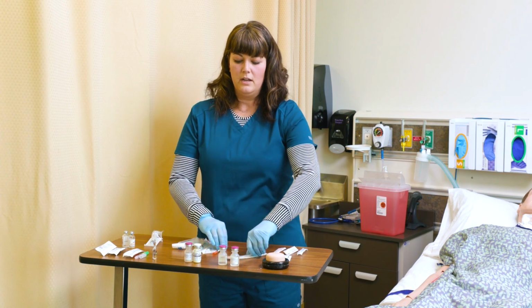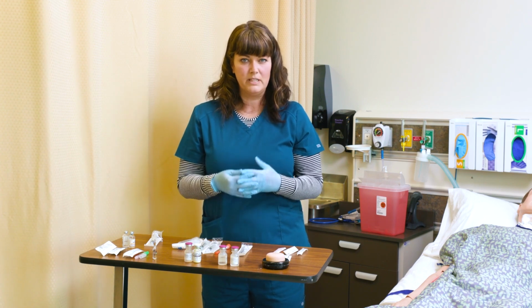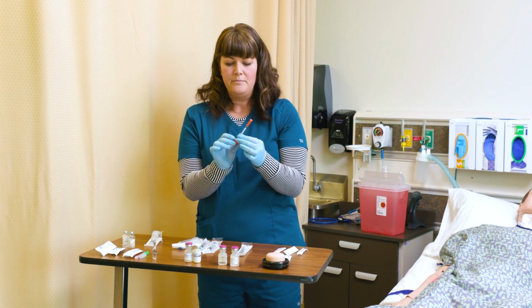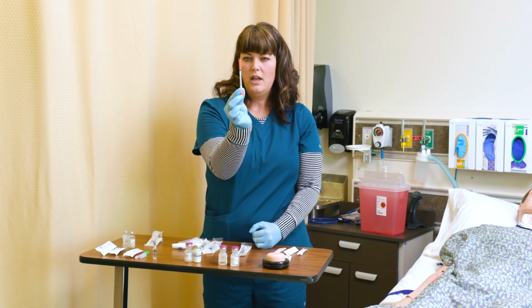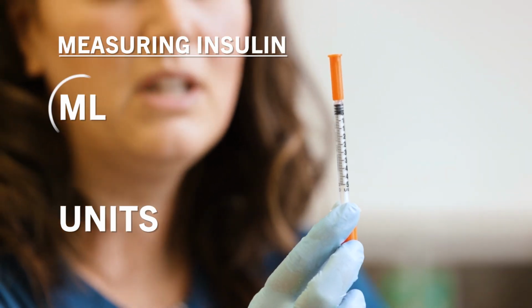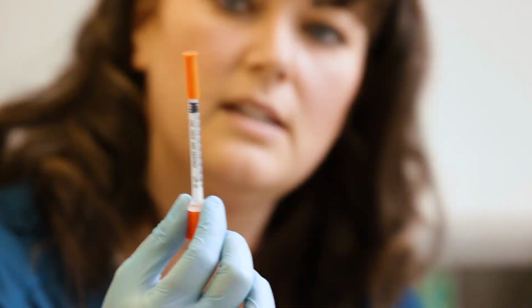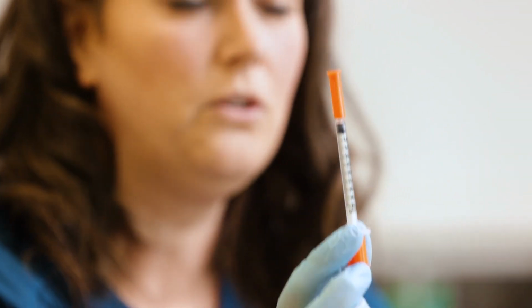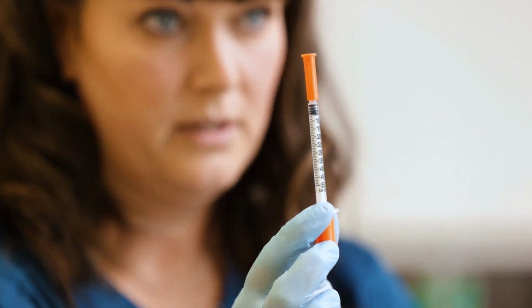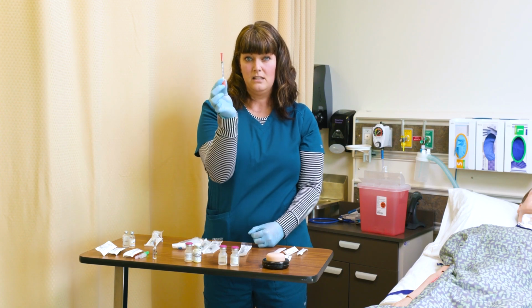Now, those are for giving medication. One medication specifically dictates a different type of syringe, and that is insulin. Insulin has its own syringe. If you look closely at this, the insulin is not measured in milliliters, it is measured in units. So we can see here that this is 10 units, 15 units, 20 units. This is not the same as milliliters. You can only draw up and administer insulin in an insulin syringe.